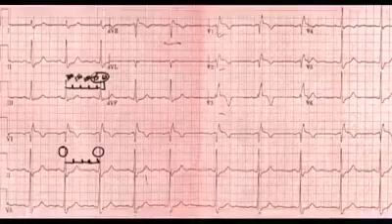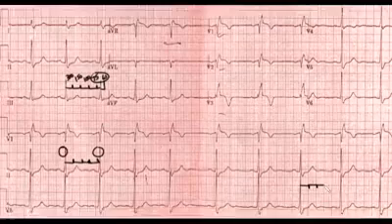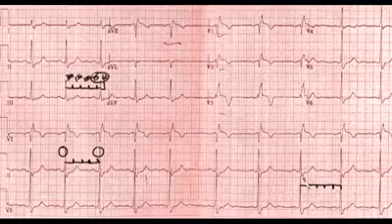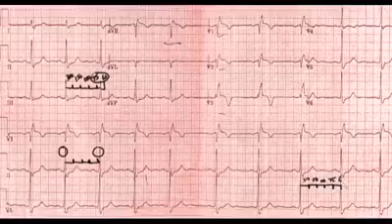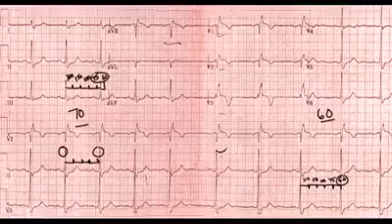Now, if we look over here on the other side of the page, we can see clearly, if we count it through, that we've got 1, 2, 3, 4, 5 boxes. So here it's going to be 300, 150, 100, 75, and finally 60 on this side. Whereas over here it's probably around 70, over here it's more around 60. And it looks as though something happened right about here where there was a change.